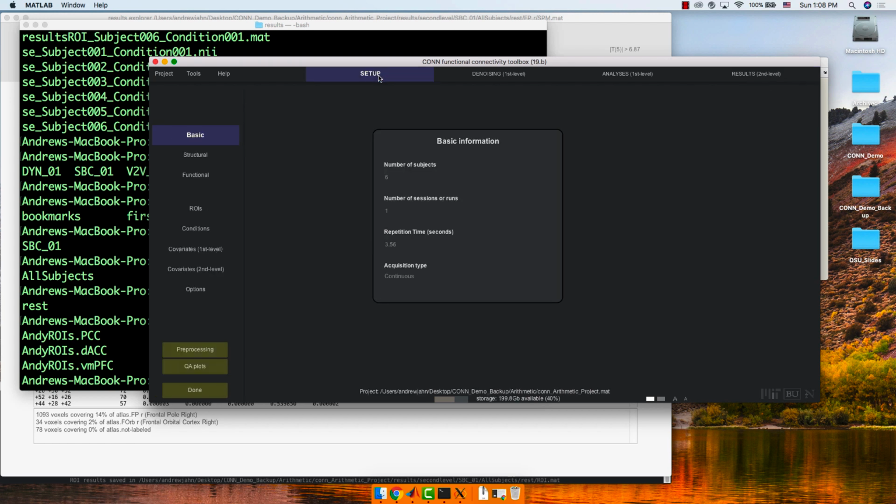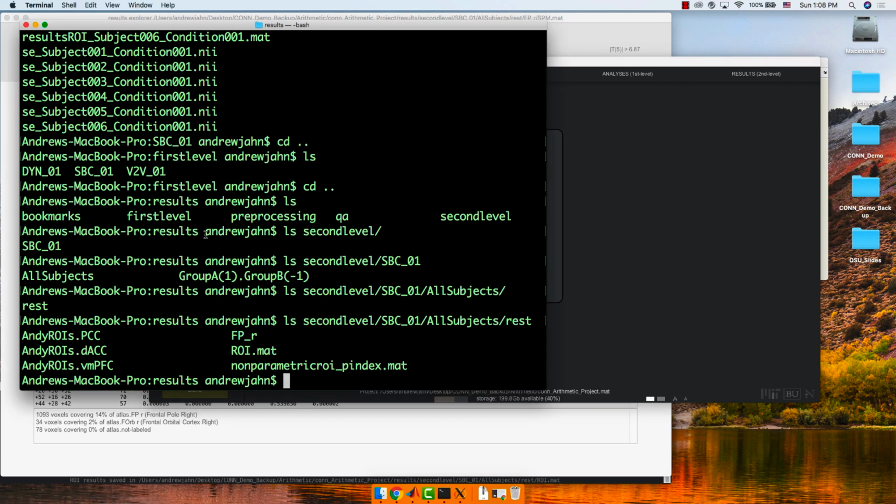All right, so a couple more things. This was something that Mike just asked about. How do you use a customized ROI, right? I'm going to show this in a viewer because it's a little bit easier to see.